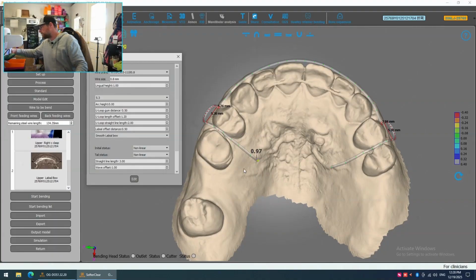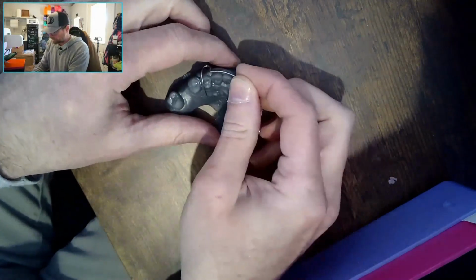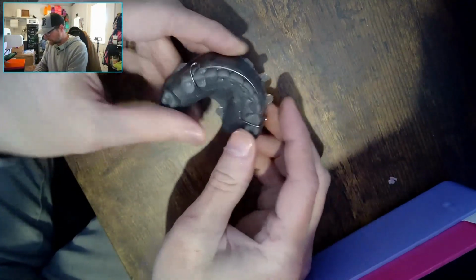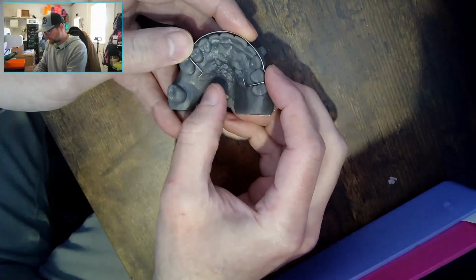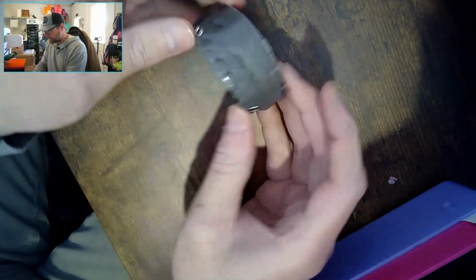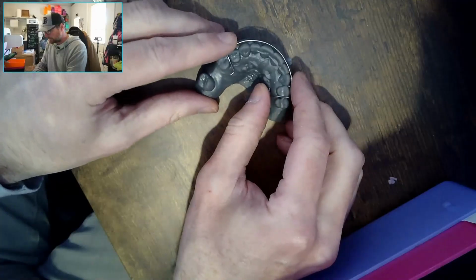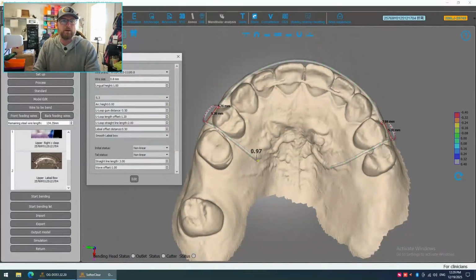So you'll have to trust me. We'll do it on the next one. I don't want to waste too much wire. I do have my little camera here. I usually put a sheet of white paper down. I don't know if this is harder to see or not. And then look how that just falls right into place. A little bit of adjustment. I'll make those bend the same direction whenever I get this ready. But let's bend that C-clasp.